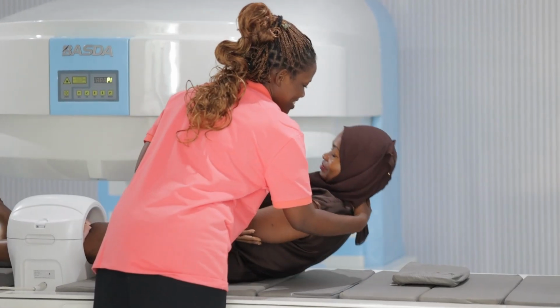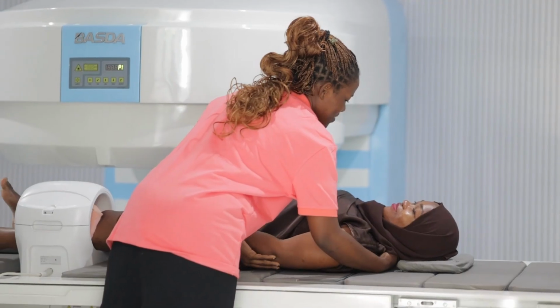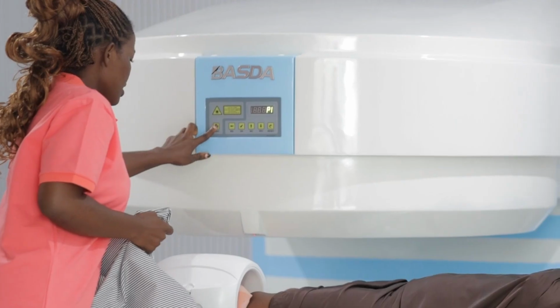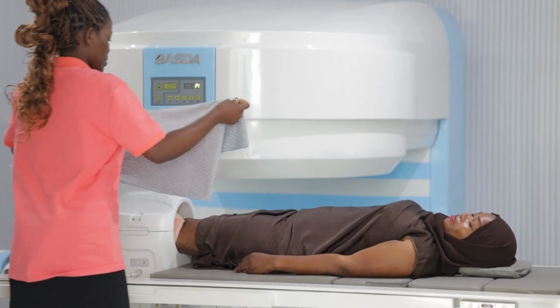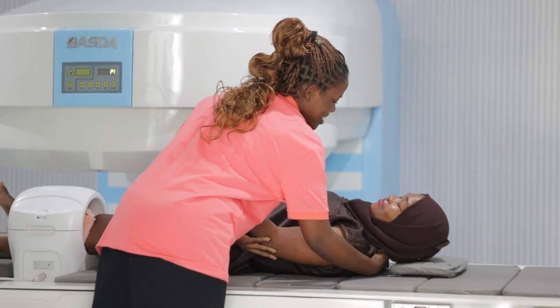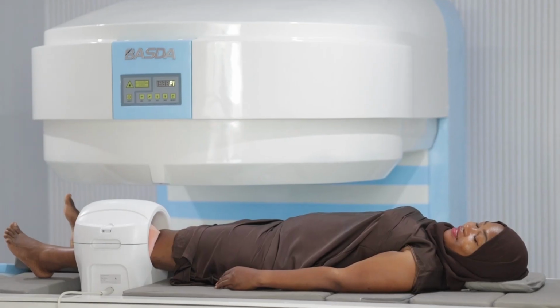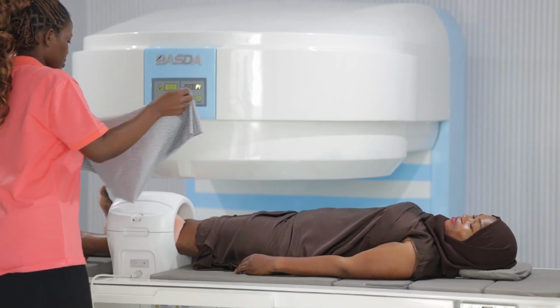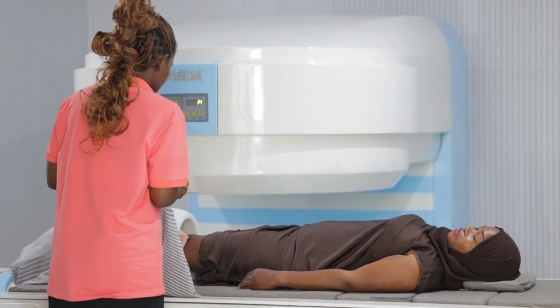The open MRI, again, uses a permanent magnet. This allows children, and can allow those who are claustrophobic. However, because of the lower magnetism of about 0.3 to 0.5 Teslas, it is a bit cheaper to install and to run, and of course it gives us a somewhat shorter range of examination. Mainly the strength is on the brain, spine, and MSK, as we shall see later.